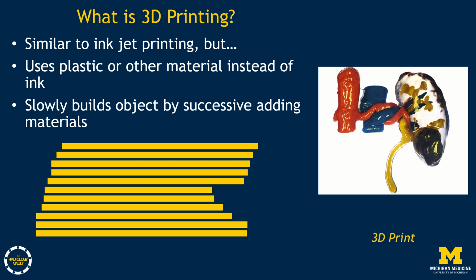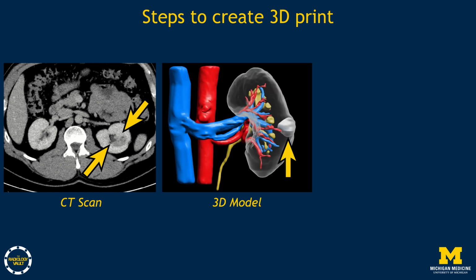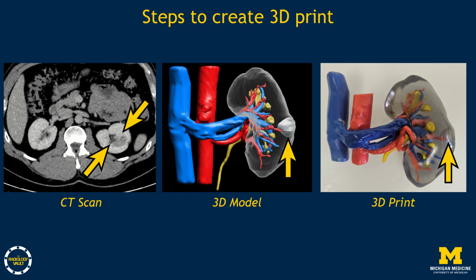in a 3D object. The steps to create a 3D print include starting with a CT scan, creating a 3D model, and then doing a 3D print. These steps we will now review.